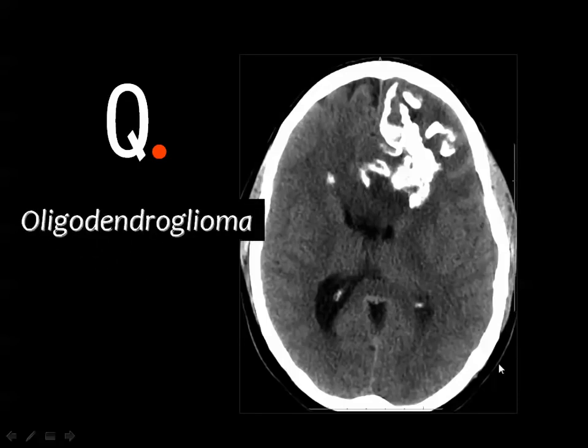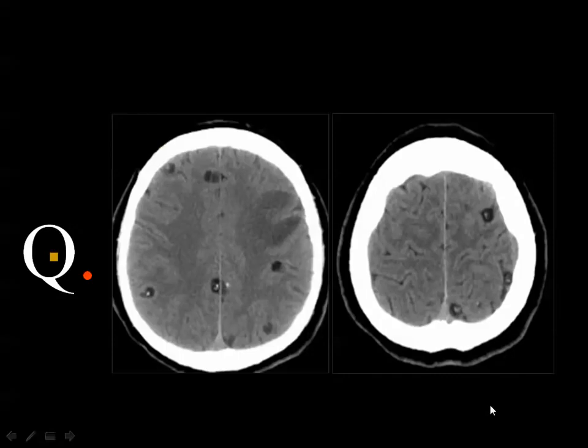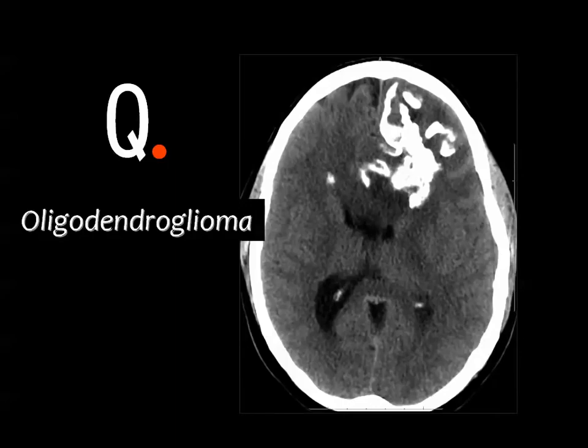Oligodendroglioma. The calcium in the arteriovenous malformation is not that heavy. It's just a linear pattern of calcification, and the AVM does not exert a mass effect unless it is associated with hemorrhage. Yes, calcium in the Sturge Weber should be in the gyral distribution on the surface of the hemisphere, but this is inside the brain parenchyma.